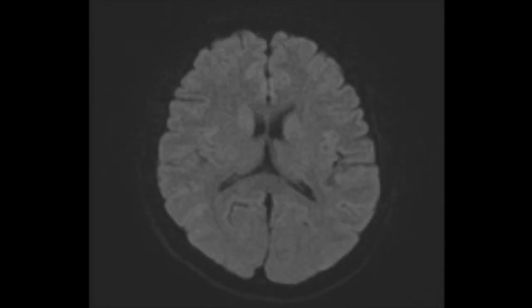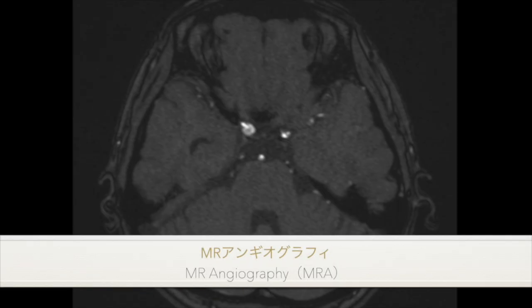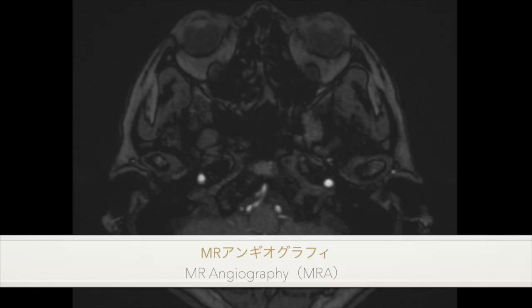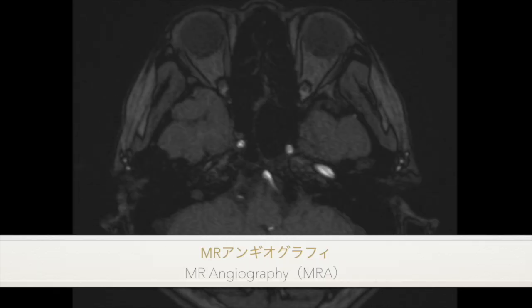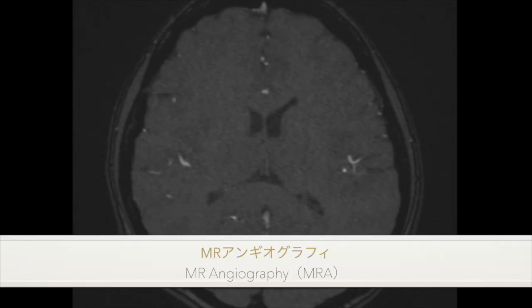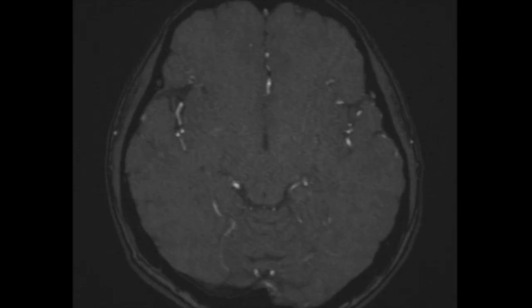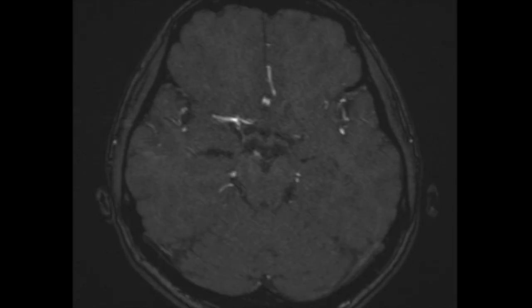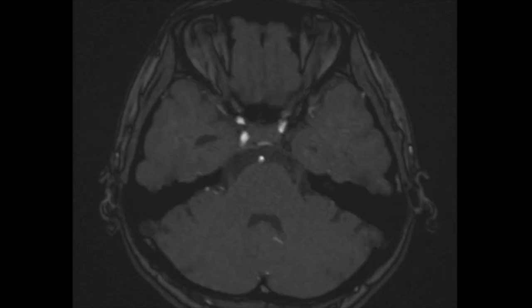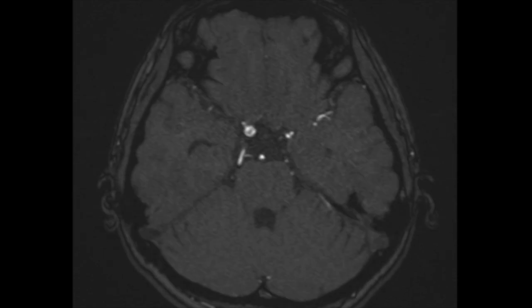Now, let's move on to this image. This is MR angiography, or MRA, a sequence specialized for visualizing intracranial vessels without using contrast. You can't see much of the rest of the brain. Only the vessels appear bright. Let's scroll through it. Do we spot anything concerning?